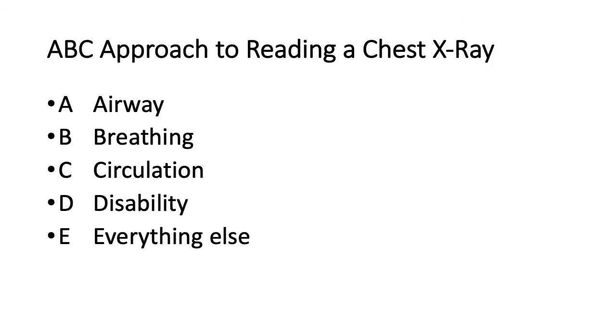Now I'm going to go over the ABC approach to reading a chest x-ray. I want to acknowledge that there are many different approaches to this, but the important thing is that you develop a systematic search pattern that you can stick with that covers all the bases.